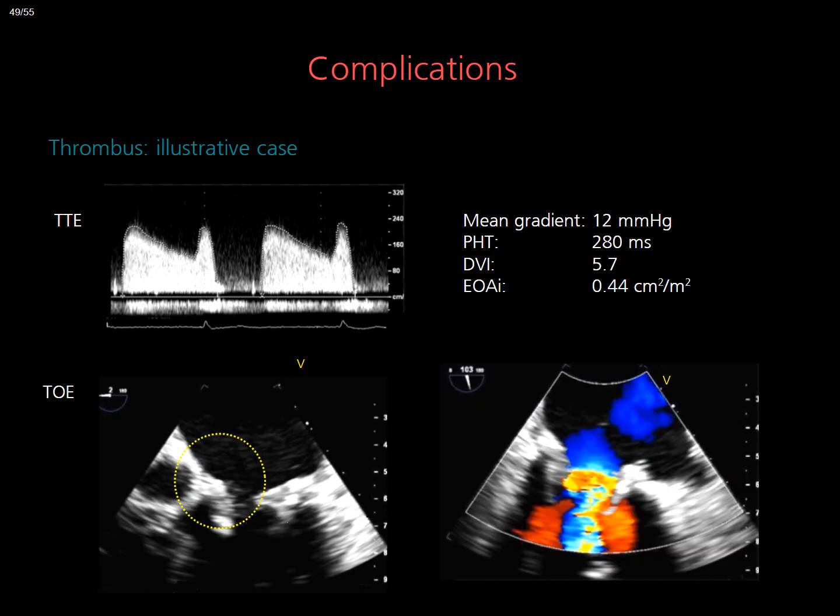With suspected prosthetic valve thrombosis, the patient was started on warfarin, and follow-up TEE after 6 weeks shows complete resolution of the mass with improved hemodynamics. The key message is to keep bioprosthetic valve thrombosis in mind when gradients rise and symptoms recur, even in tissue valves.